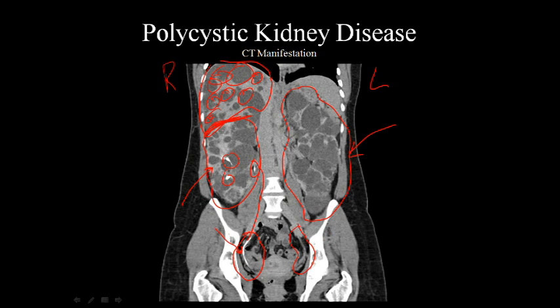And so we see that kind of bore out too, that there is not much normal tissue, and the normal tissue on the right has a certain degree of highlighting effect, whereas the left really doesn't. So it's potentially that this left kidney has completely or almost completely shut down in its filtration effect.